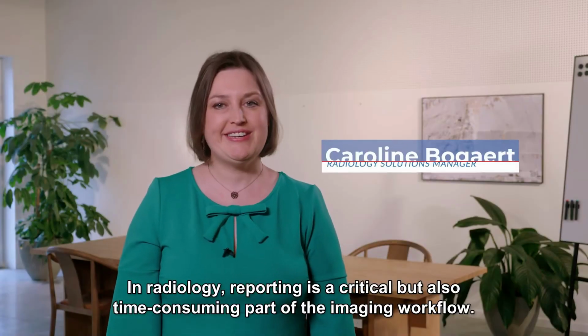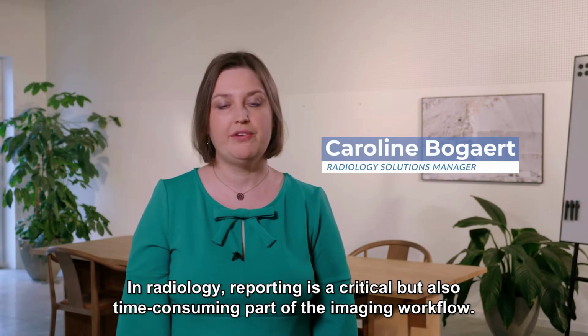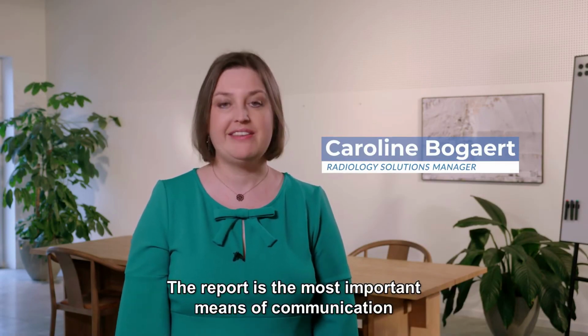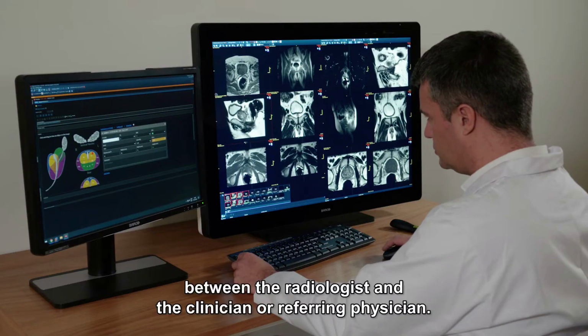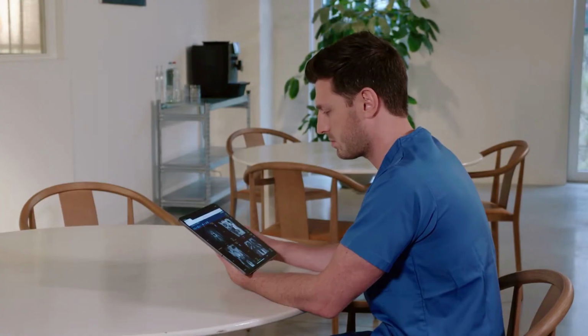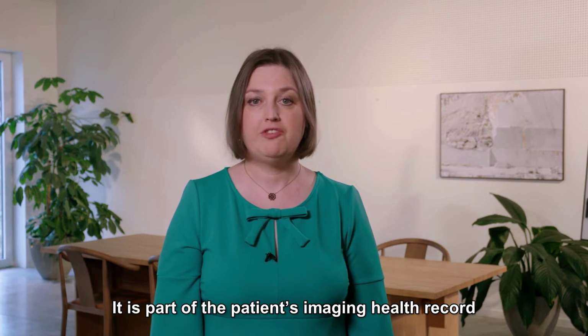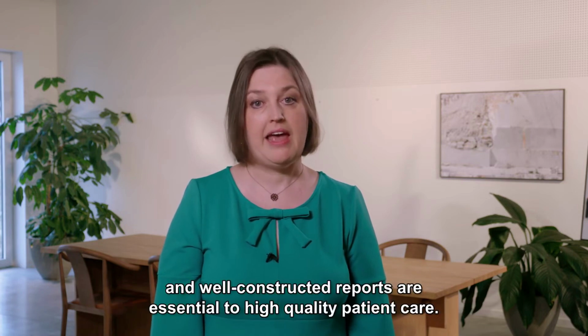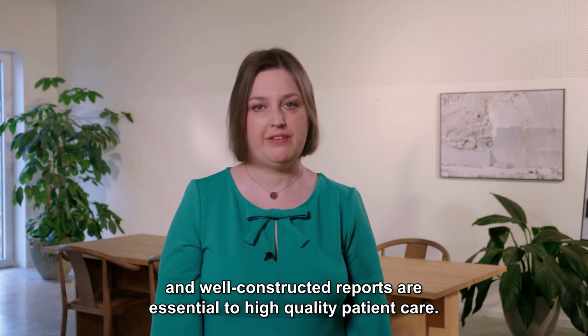In radiology, reporting is a critical but also time-consuming part of the imaging workflow. The report is the most important means of communication between the radiologist and the clinician or referring physician. It must provide clear, meaningful diagnostic information. It is part of the patient's imaging health record, and well-constructed reports are essential to high-quality patient care.